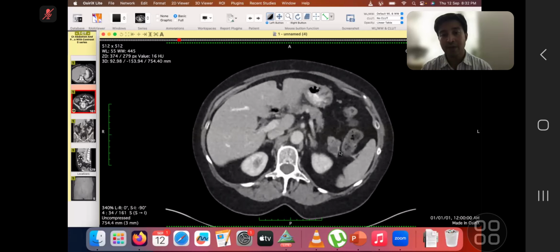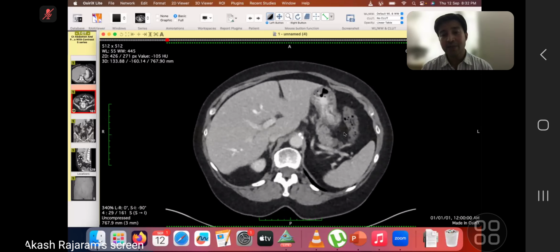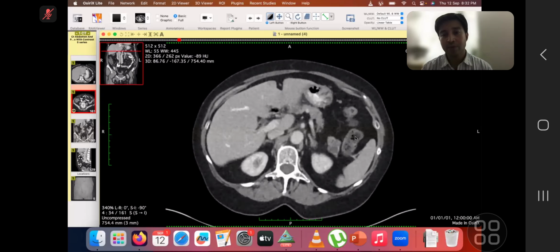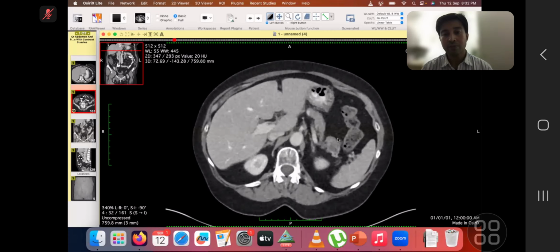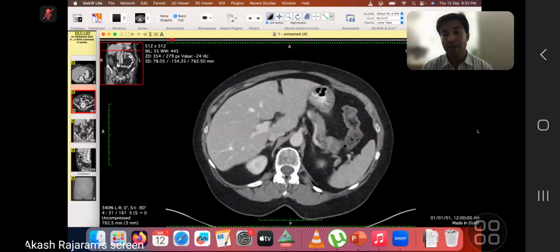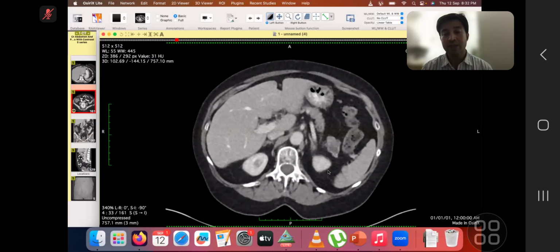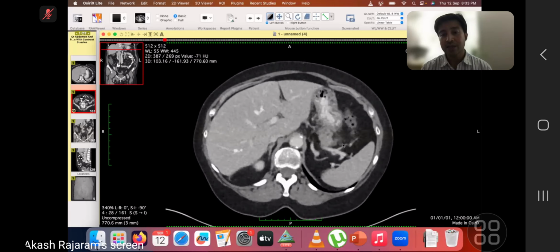You correctly mentioned all the points. You mentioned that you can do a CT guided biopsy, but I don't think you can, because you need a window, and it's a cystic lesion. There is no solid component in this lesion to biopsy to start with, and secondly, there is a bowel and a spleen. There's no clear-cut window to do a CT guided biopsy, even if you had to. There's a cystic lesion with some enhancing septa, but no obvious solid component, no pancreatic duct dilatation. It's not infiltrating the surrounding structures.